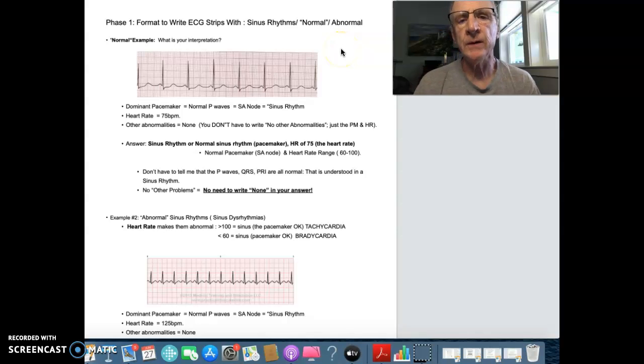This is another short video showing us what to focus on when we're looking at ECG strips that ask for our interpretation. Today we're going to talk about ECG strips that have the dominant pacemaker as the SA node, causing sinus rhythms. In this case, you find this in your quiz. They ask you for your interpretation.